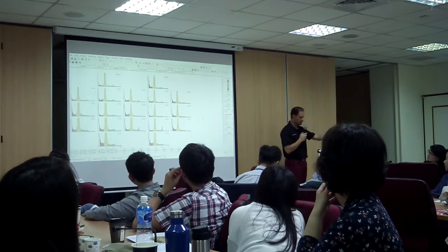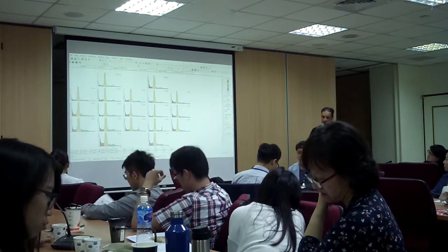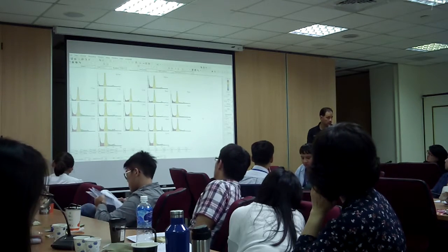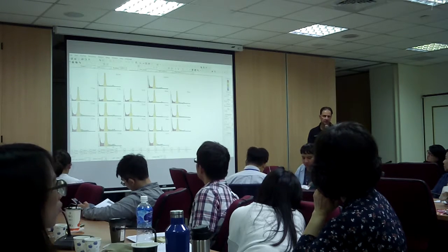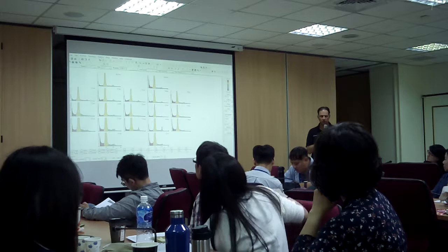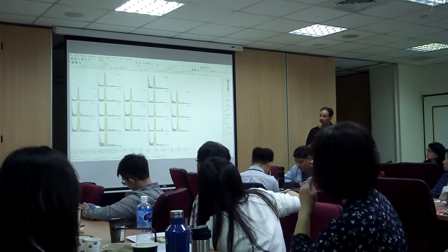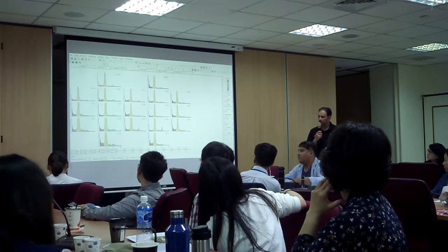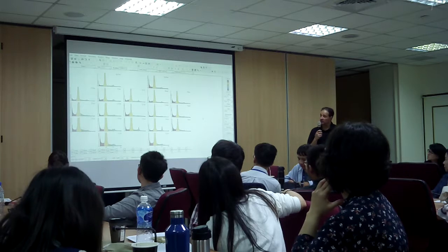So what does the high beta mean? It's hyperarousal, right? So it's going to be what? Anxiety. And there's some anxiety going on. Obviously, he just lost his wife. At the time I did the qEEG, his wife had passed away two or three months ago. It was very, very recent. So it could be the anxiety being generated. But we have a huge alpha response, right? And that's significant. So we have diffuse alpha.